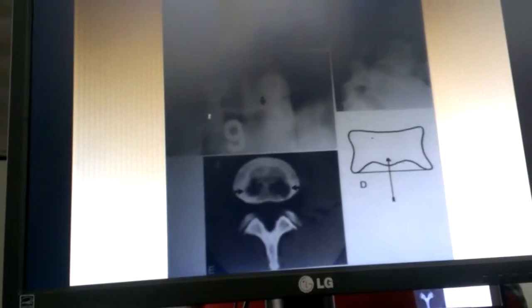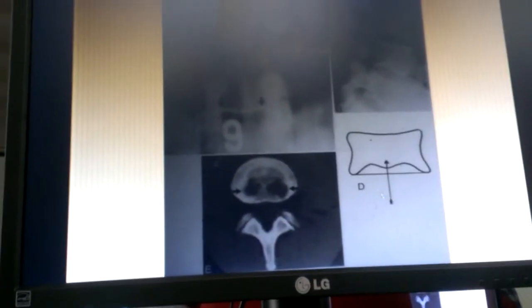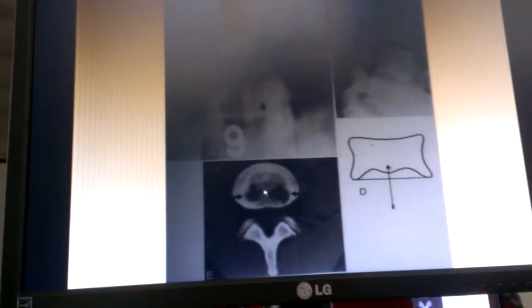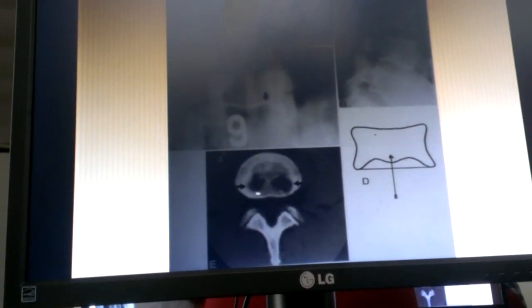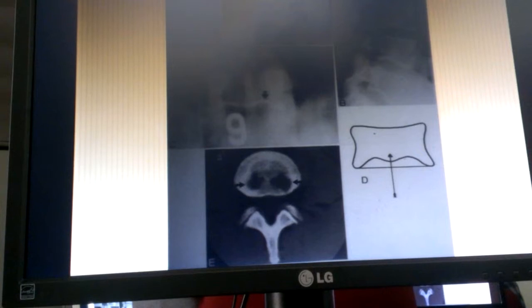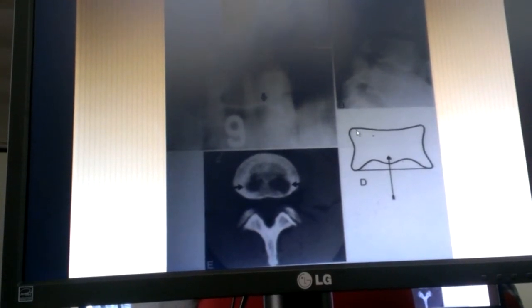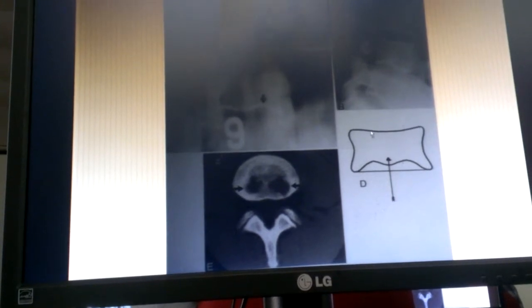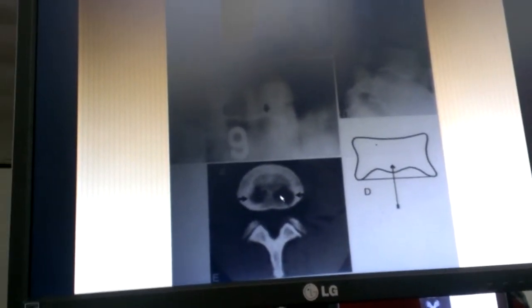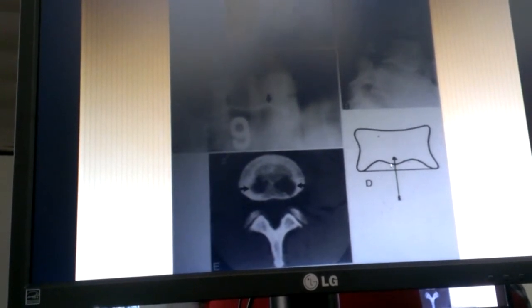Okay, and here is the Cupid's bow, right? This is the bow part, the arrow is there. And if you look at CT, this is what you might see, areas that aren't as radiodense because it's just not as thick when you think about it. This is a thicker area when you measure from top to bottom as compared to this area. So there is going to be a difference in the bone density where the impression is. Right?